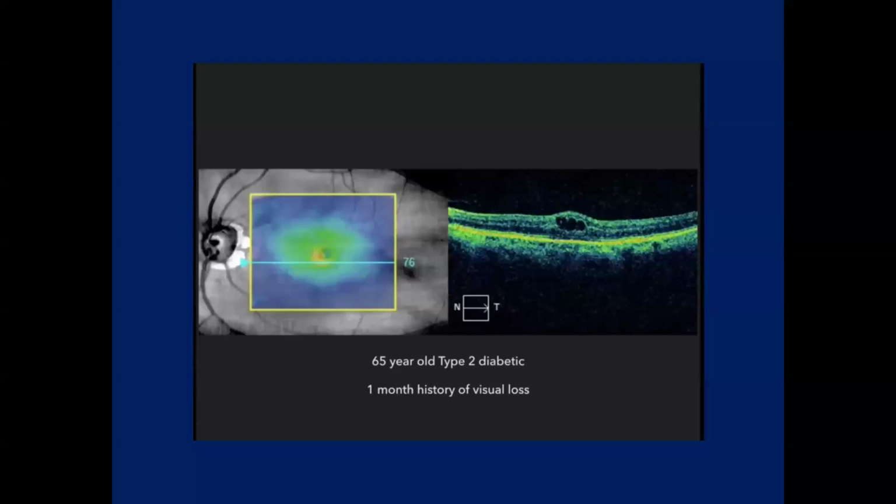No laser treatment. The patient presented with visual reduction, almost loss, and the picture of the OCT shows like this. Printout. Is there any further investigation you want to do or further comment you want to give on this scan?